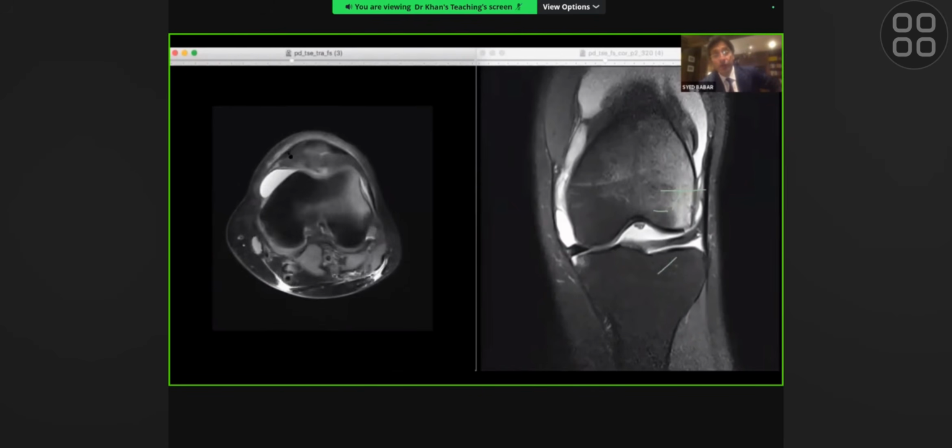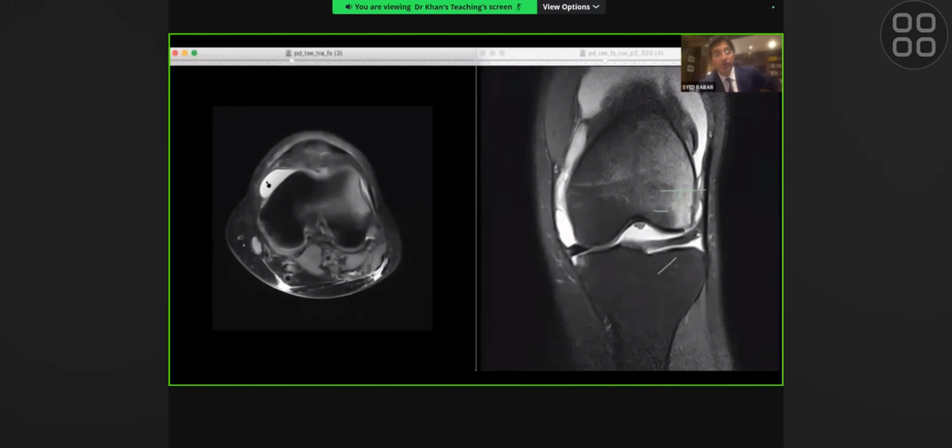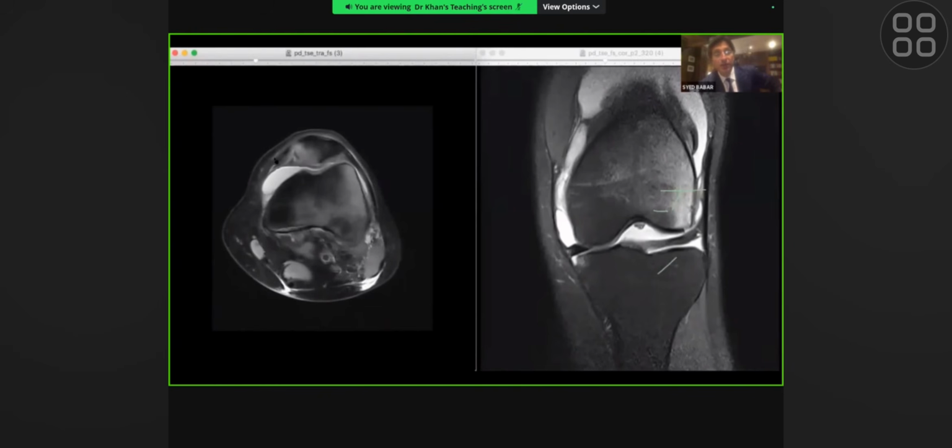So you have to now follow the medial patellar femoral ligament. Remember, I was telling you medial patellar femoral ligament. So this is part of the medial patellar femoral ligament, which actually doesn't look too bad, which is actually intact. But it's the medial patellar retinaculum which is torn. Now, what else happens when you transiently dislocate the patella?